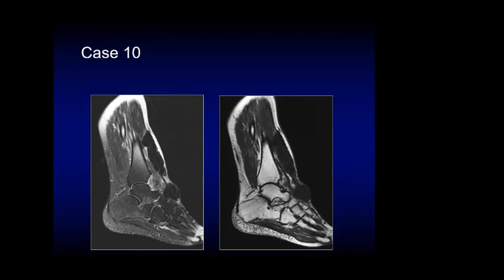Yes, here the lower limb shows abnormal signal intensity in the form of low signal intensity in T1 and T2 in the extensor aspect of the foot and lower knee, anterior to the tibia.